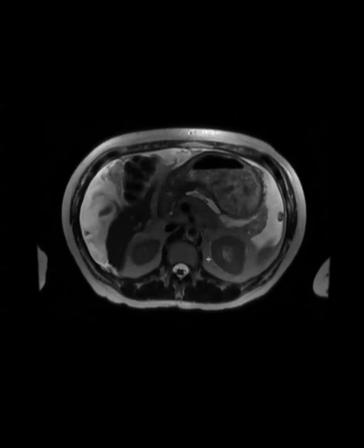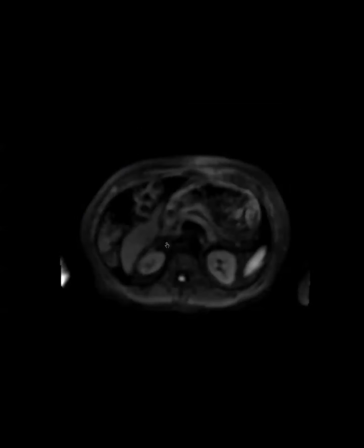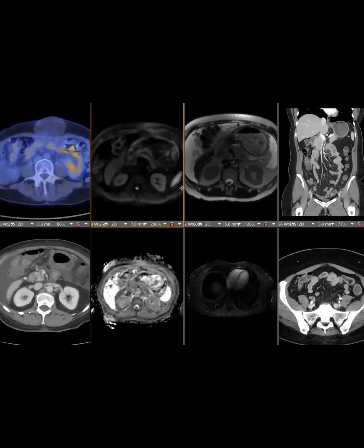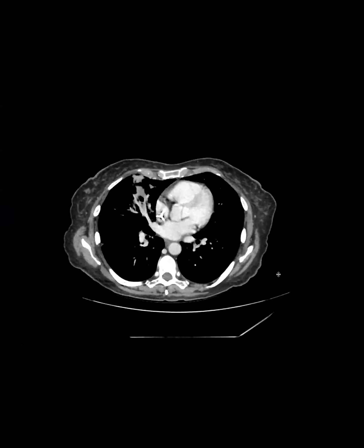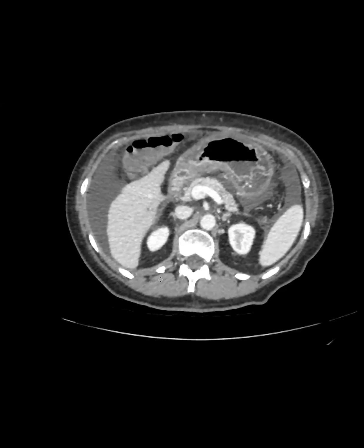So this was the T2. And I think in this case, the diffusion is really helpful. Visual of recurrent disease in the stomach. So we saw the pre-treatment disease in the antrum, and you see it's restricting right there. If you look at the CT, do I have the CT? None of that is apparent. Here I do have the CT. EGD's not good at that. No, it's not. And so, oh, here, that was the CT.